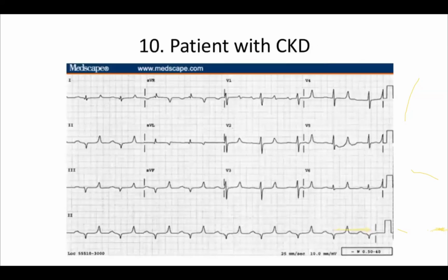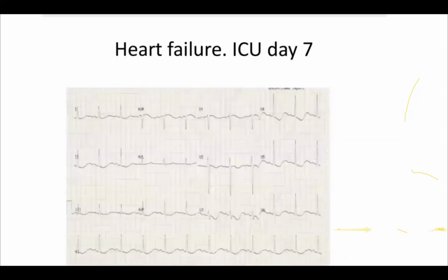Okay. So again, more or less the same. Usually they can give the hyperkalemia ECGs telling that the patient is having CKD, right? That is why I have put the same thing here, right? So heart failure in the ICU day 7.